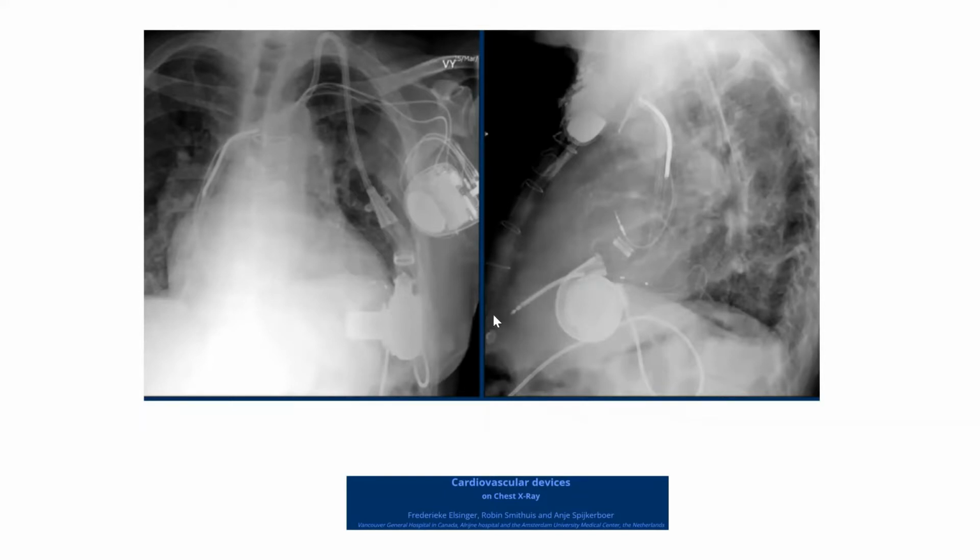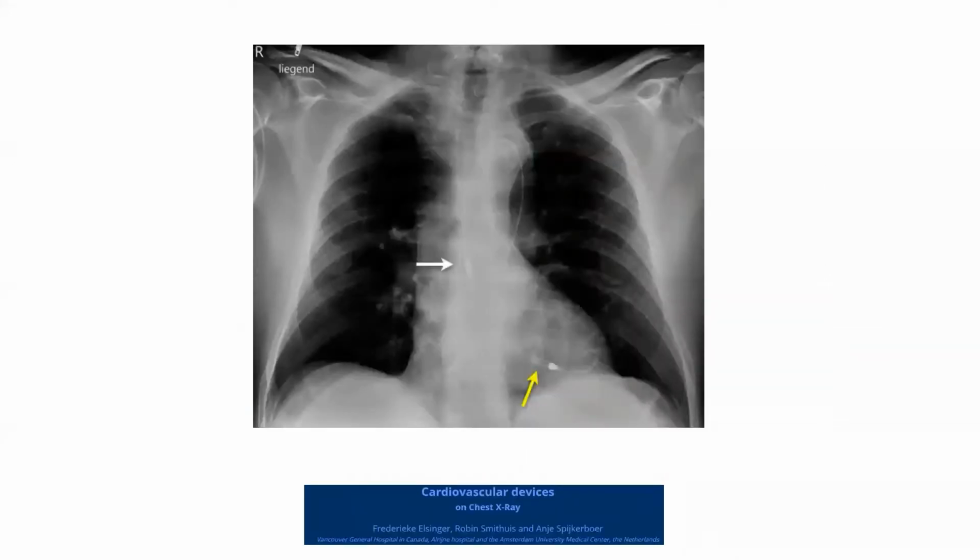And this patient is having an ICD. You see the coils, it's an ICD. Okay, probably even CRT, I don't know. But this is LVAD. Okay, good. Now, if this is LVAD, what is this? No, but close. You are close.